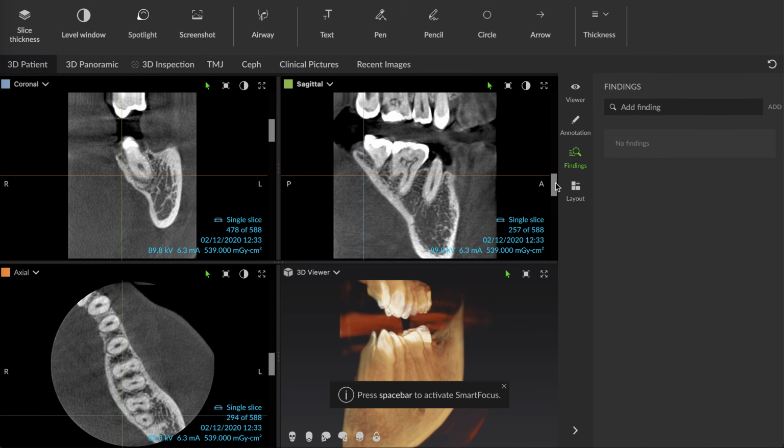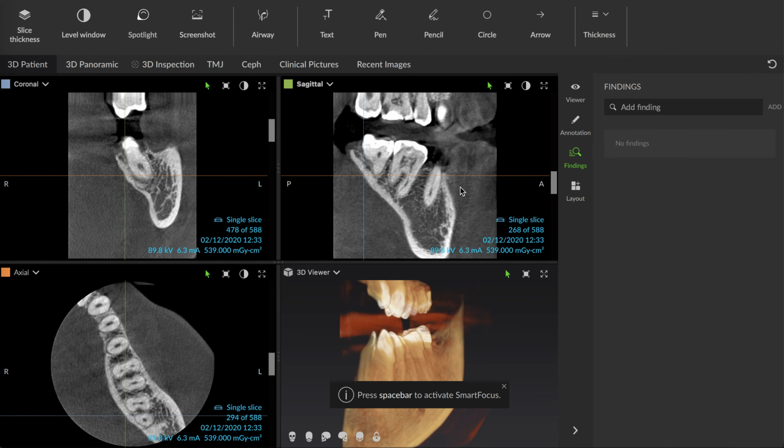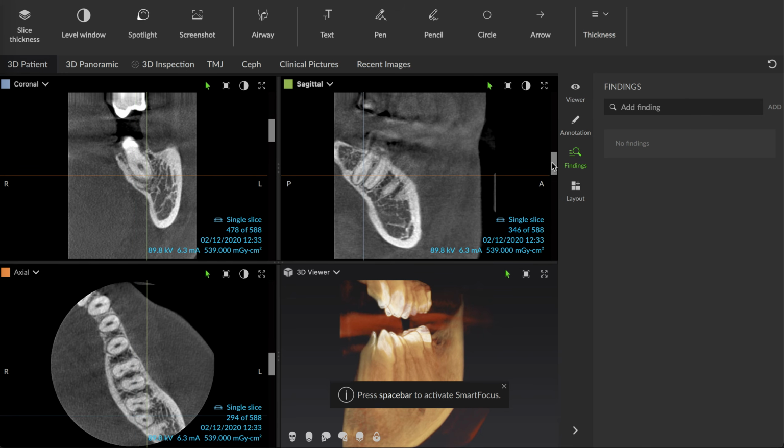But yeah, great case, easy case, slam dunk with a CBCT to help diagnose and identify where the concerns are, and for the patient to be able to see that right in front of their face, and for me to be able to walk them through the image. It's just, they diagnose themselves. I know I've said that before, but they can see it. It's clear what's happening once we explain it, and they move forward with treatment. So what a great opportunity, again, to help this patient.